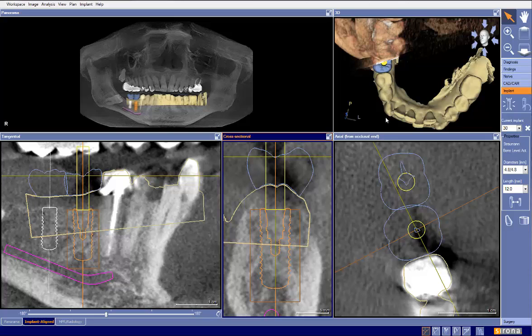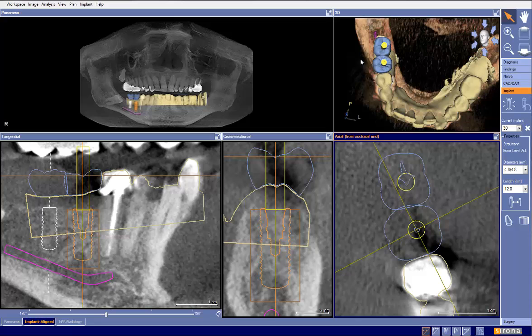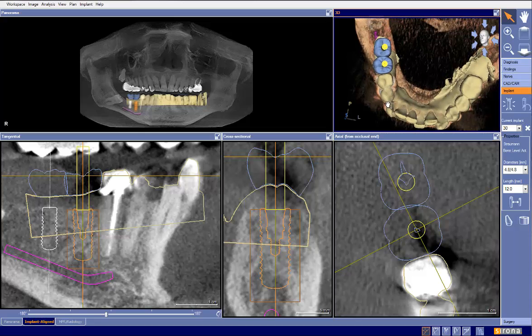So hopefully this has been helpful, and I appreciate it. So in conclusion, a couple of things. Number 30, we definitely were too lingual on that plan. We needed to move it to the buccal and then tilt it back to the lingual. We can look at a CEREC design and see that it is definitely too wide buccolingually. And then also our nerve mapping may be slightly incorrect right here. So thank you very much.